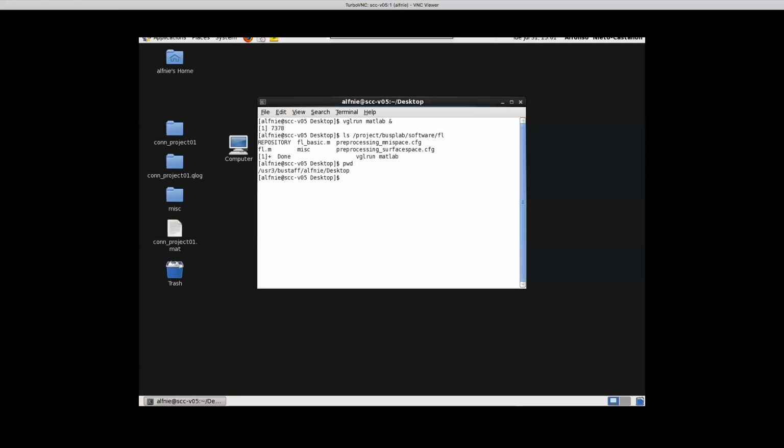It inflates that fully until it gets a spherical representation of that subject's brain, and then it looks at where the sulci and gyri lie within that sphere and tries to find a nonlinear deformation of that spherical representation so that the gyri and sulci are matched to the template, so that every subject should have on that spherical representation the gyri and the sulci roughly in the same location. That's the goal of a FreeSurfer normalization, intersubject correlation or normalization. Does that make sense?